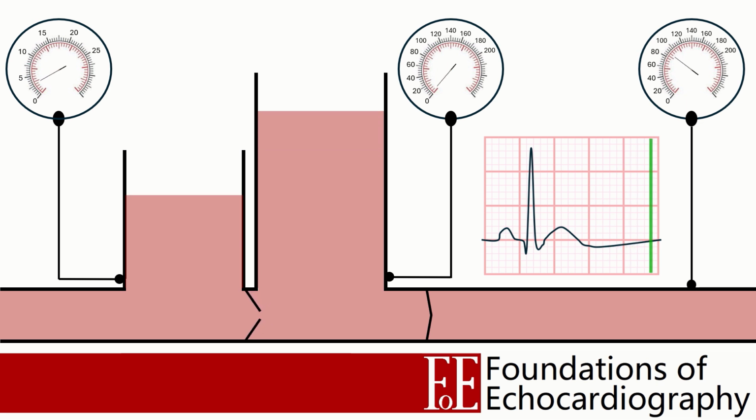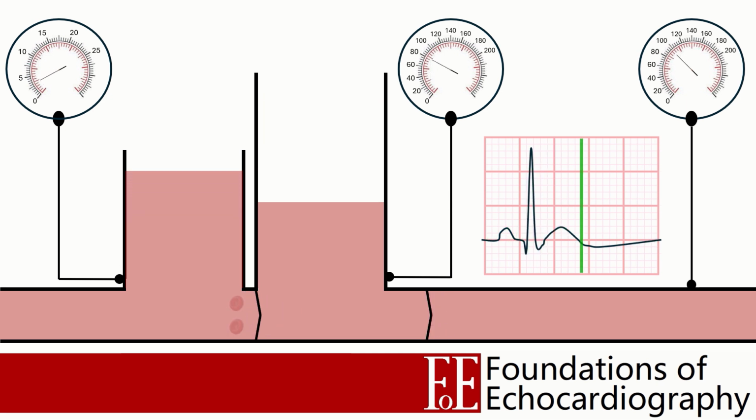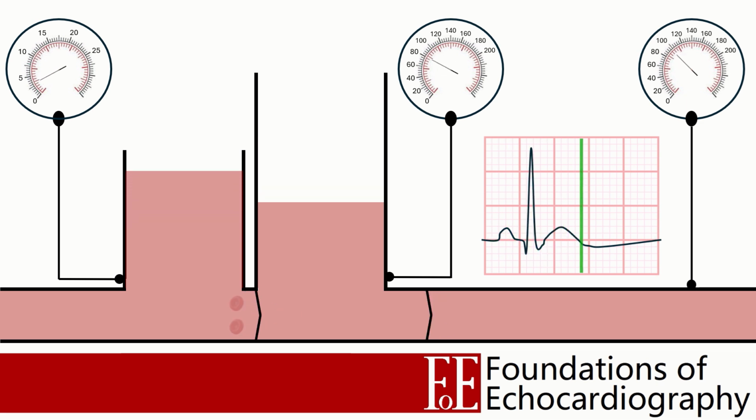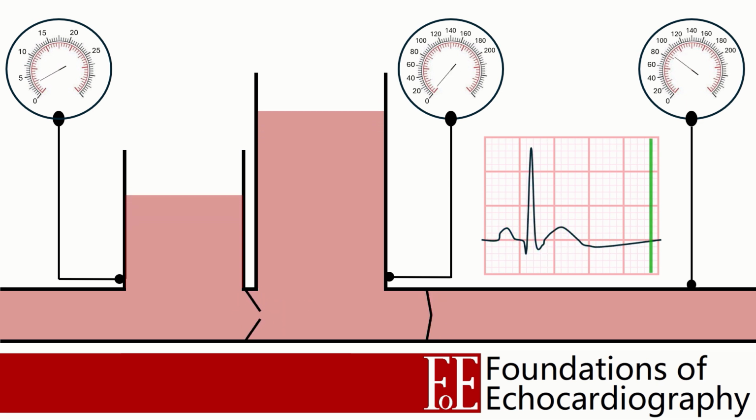In health, and when the heart rate is within the normal range, these two phases are separated by a period of diastasis, where very little filling occurs. However, when early filling is delayed or prolonged, especially at faster heart rates, these two phases can overlap. As ever, the flow of blood from the left atrium to the LV is driven by the pressure gradient between the two chambers, and so will be affected by LV relaxation, LV stiffness, and left atrial pressure.